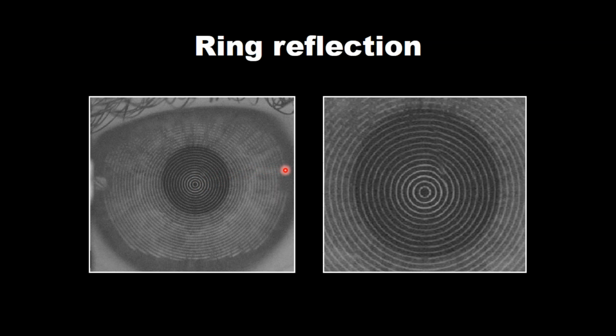So zoom in on those central rings and make sure you're not seeing the breakup or distortion of the central 10 to 15 rings especially. That's going to create, or has the potential to create, a significant amount of topographical error.